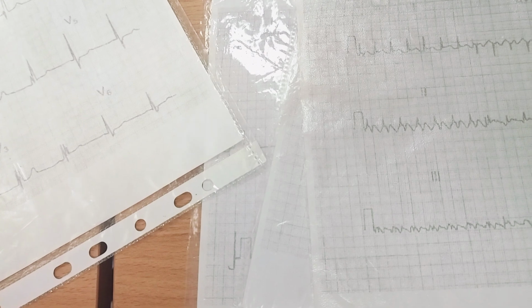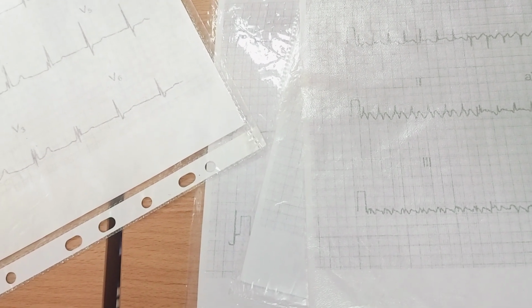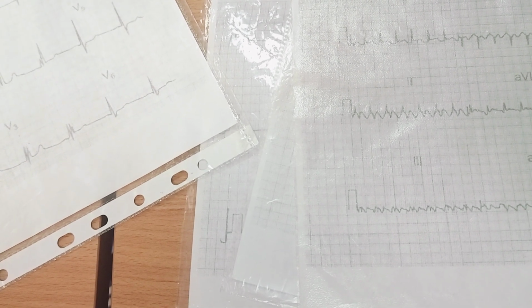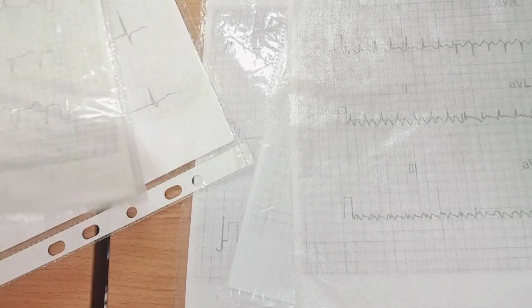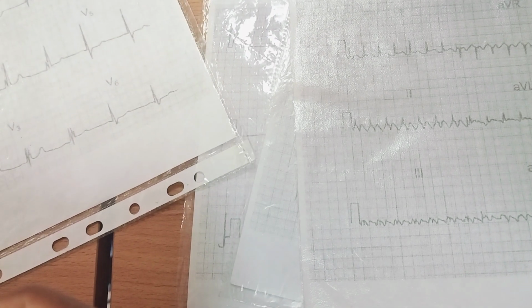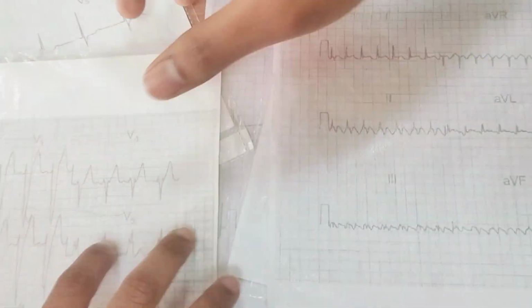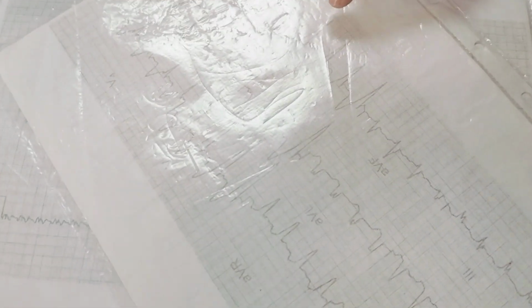If there is heart block, if there is tachycardia, depression of the ST segment, a little bit elevated ST segment, changes of the T wave are not ischemia. We don't know if it is ischemia or not. It's not clear using ECG only. If the patient has chest pain, we can suspect ischemia and we need to do laboratory testing.